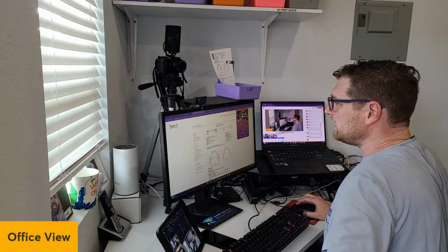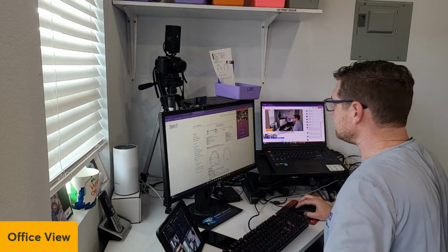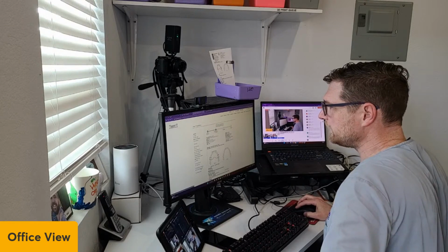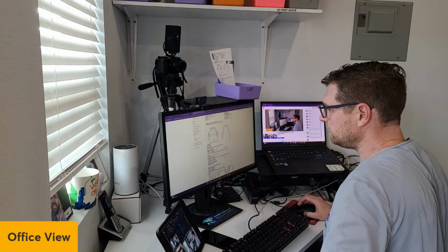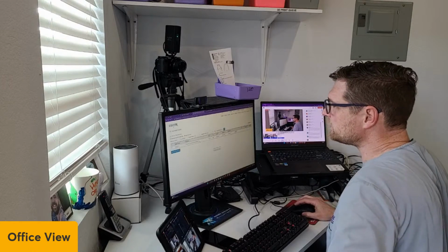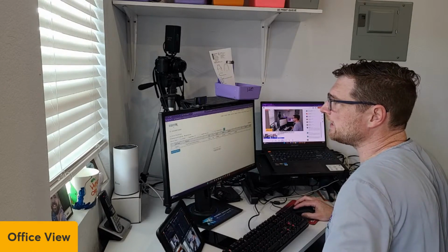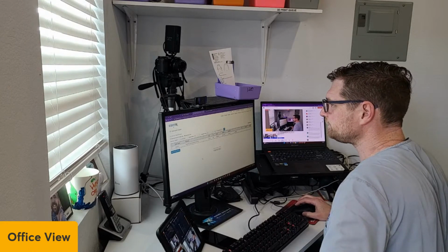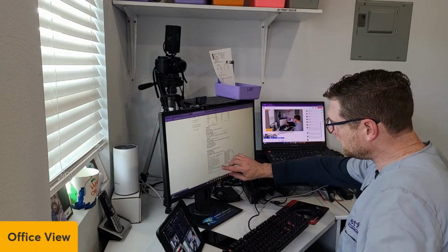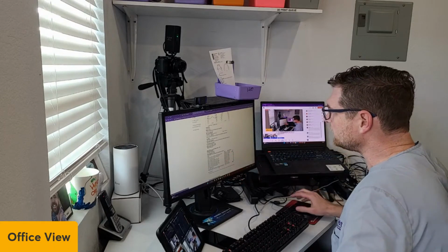Let's actually check the process on that while I'm on this screen here. Nope. We'll see. Sometimes they'll say, oh, it completed. So let me go back. And there it is down here at the bottom of all the things.